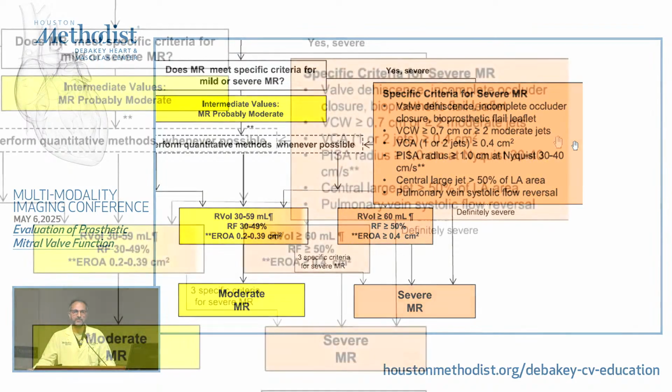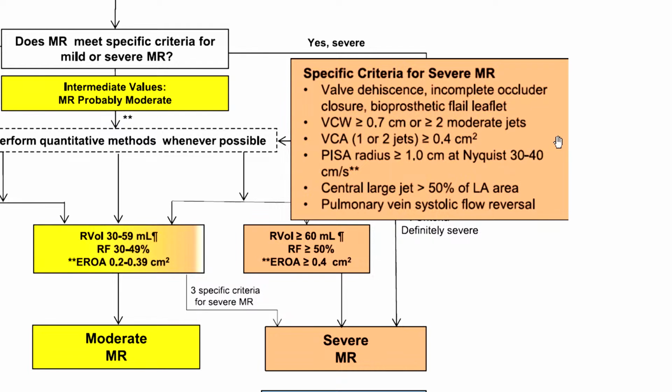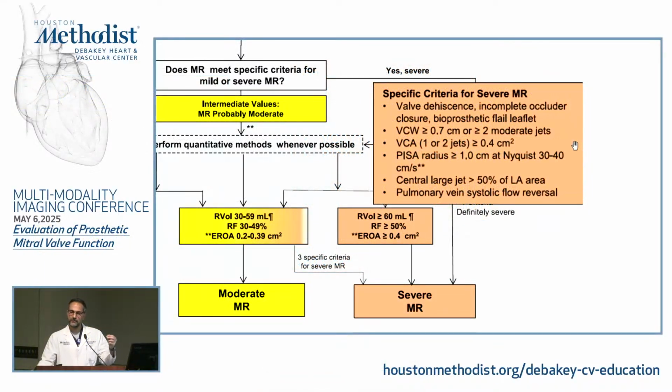So typically, let's say if you have a bioprosthetic valve, whether it's on the aortic or mitral side, if the leaflets are normal, typically you don't see them. They're almost invisible to most echoes. Once you start seeing the leaflets, and when they're calcified, there's something wrong, right? If there's calcified leaflets, a stuck leaflet. So this is a feature that you have to start to think about whenever you're looking at the assessment of regurgitation or stenosis. The rest mostly applies to native MR as well.